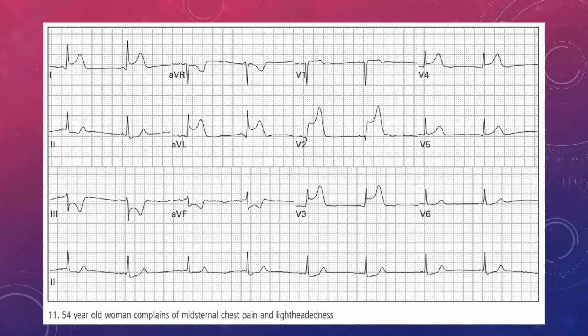So let's continue. All right. So you get in front of your patient. The ECG is even done for you, and this is what you see. So immediately, when you see an ECG like this, it's always scary because you start to think, okay, listen, there's a lot going on in this ECG. What's really going on? What's really happening? So let's try and break it down bit by bit.